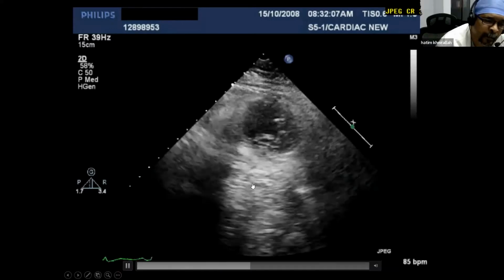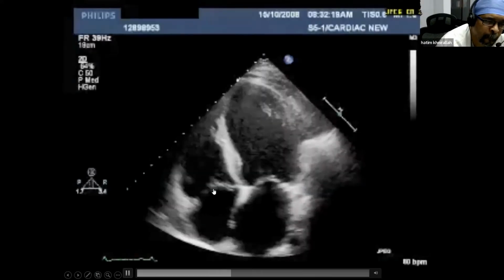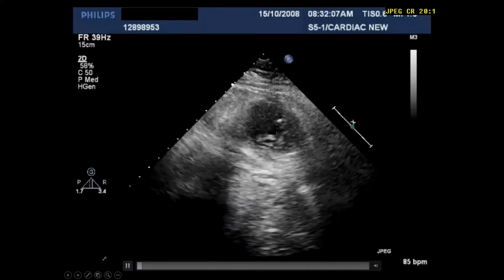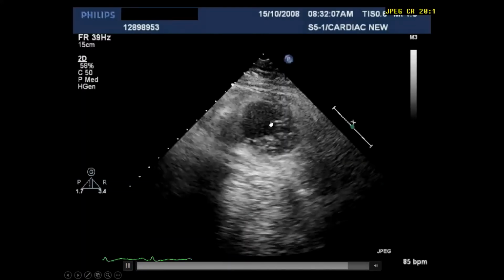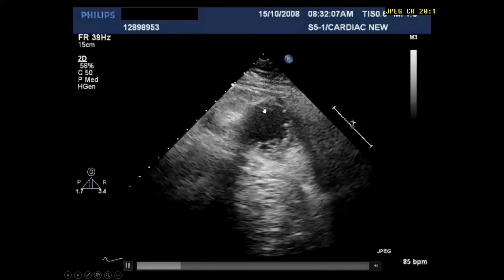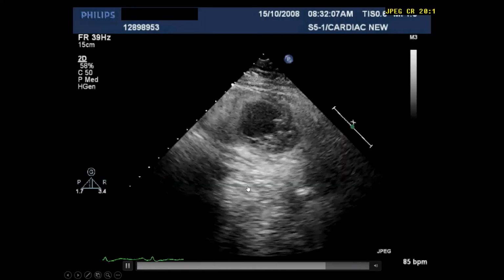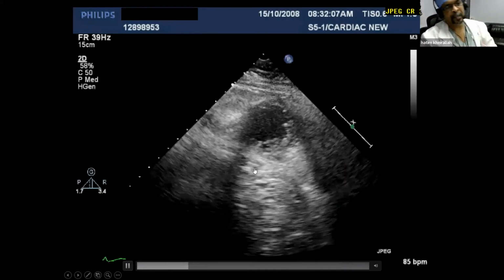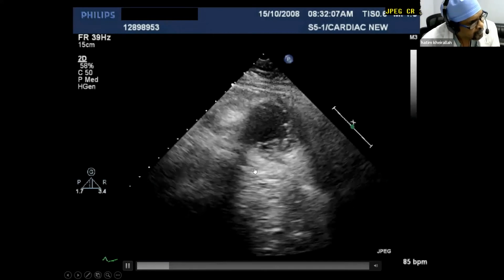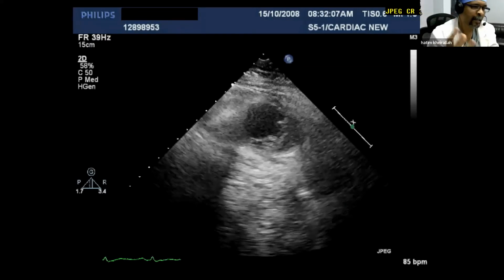Inward movement, inward motion of the myocardial muscle. If it is not going inward, this means that it is akinetic. The dyskinetic will go outside, to the out. Yes, exactly. So akinetic means you have no appreciable thickening and contraction.